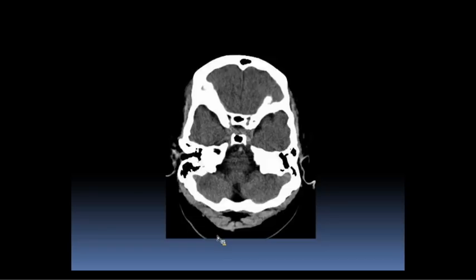And on the same topic, anyone see the abnormality here? This is again one of those things we said was potentially the earliest sign of an acute stroke, but in a different location. So this is a dense basilar sign. Here it's a little tougher because you don't have the other vessels to look at as a comparison. But this basilar artery is thrombosed and it's too bright.